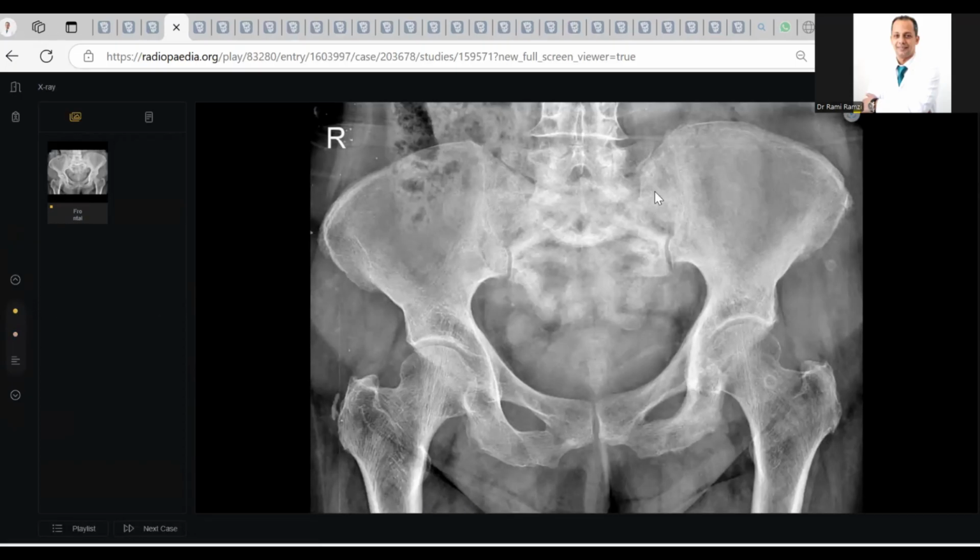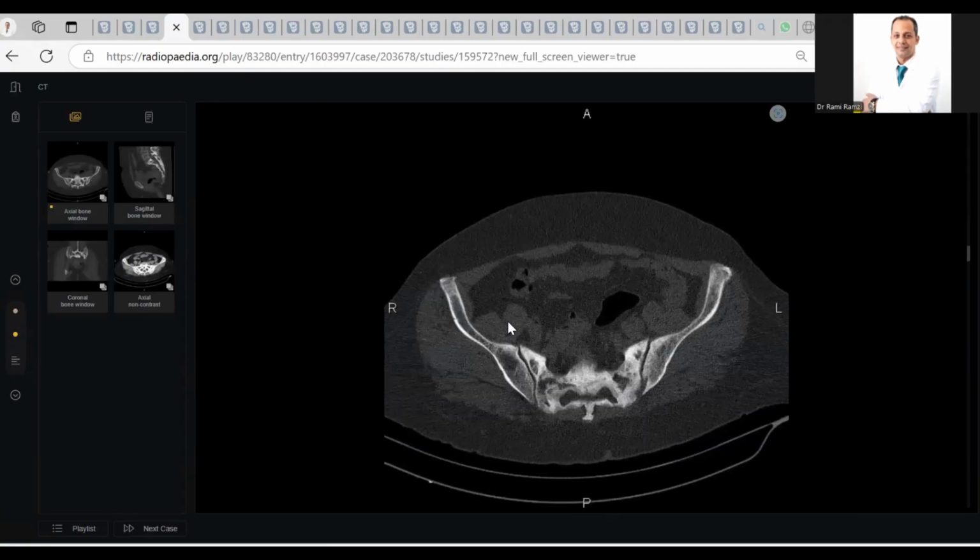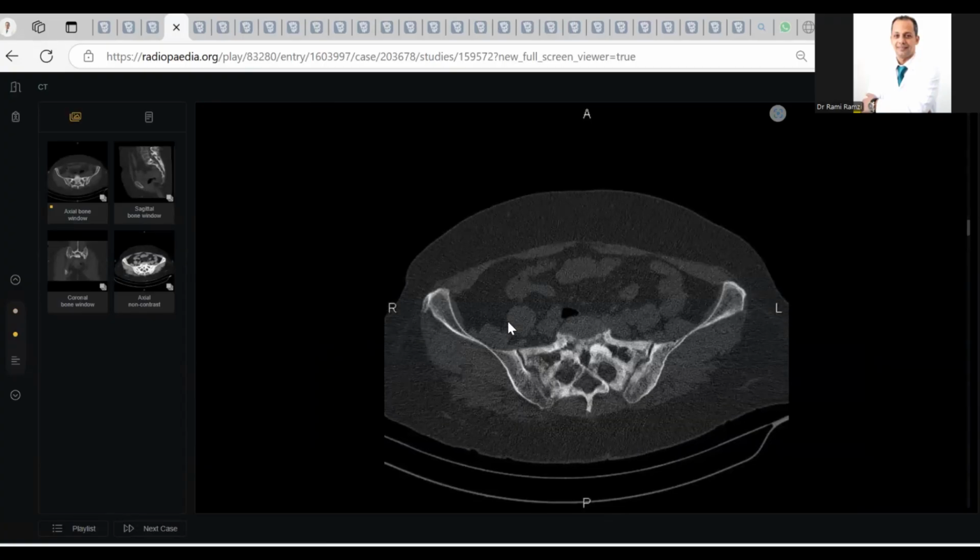Why? There is sclerosis here. Yes, you picked it up well, and then you go to both sacroiliac joints. A sacroiliac joint in a 60 years old patient is very good. Concentrate here. I see sclerosis. I suspect there is coarsening of the trabeculae and thickening of the cortex. Next step is CT, better. The CT here confirms a diagnosis of Paget.